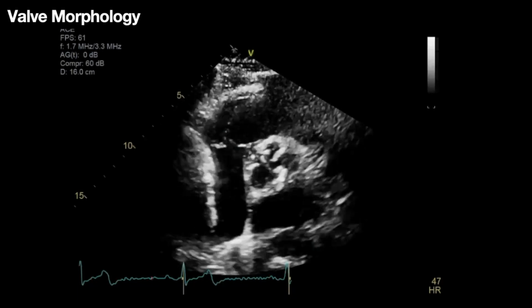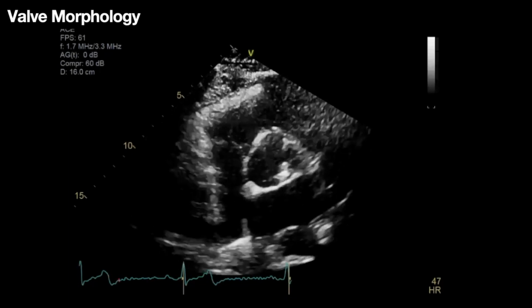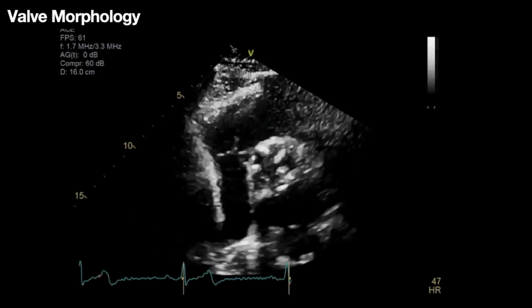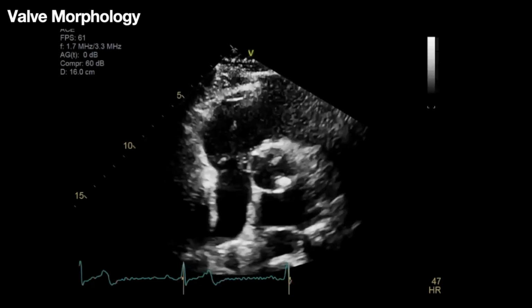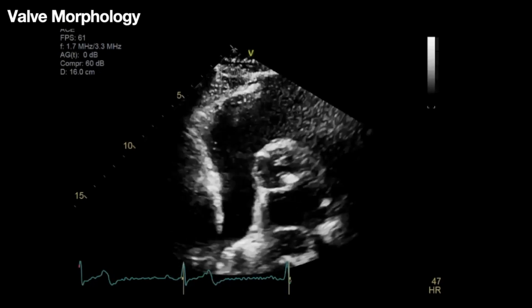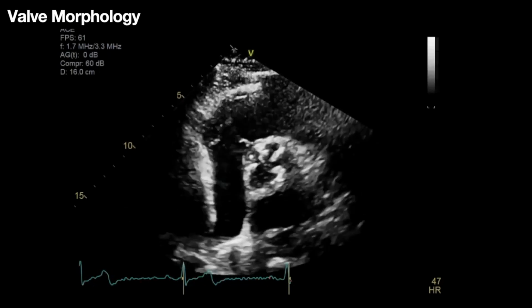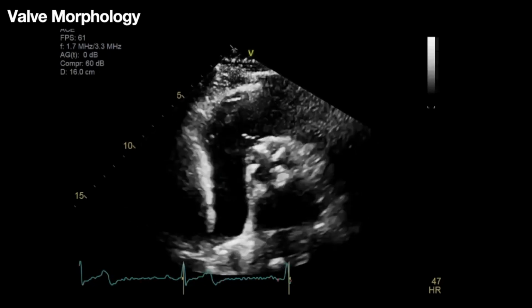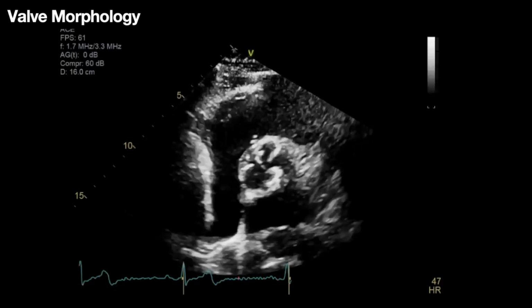This is intended to trip you up, to illustrate the point that because bicuspid valves can degenerate and calcify like trileaflet valves, it can sometimes be quite difficult to assess on echo. Because of the chunks of calcification, this looks like it could be 3 cusps, maybe 4 cusps. Turns out that this is actually a bicuspid valve with big chunks of calcium, so calcification of a bicuspid valve. This illustrates that sometimes we can't necessarily be certain with echocardiography about the morphology of the valve. It was supposed to cause a pause, which was by design.